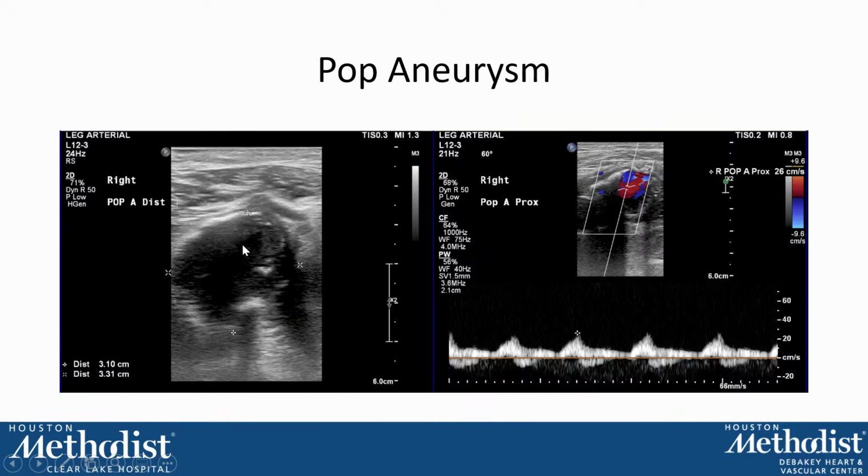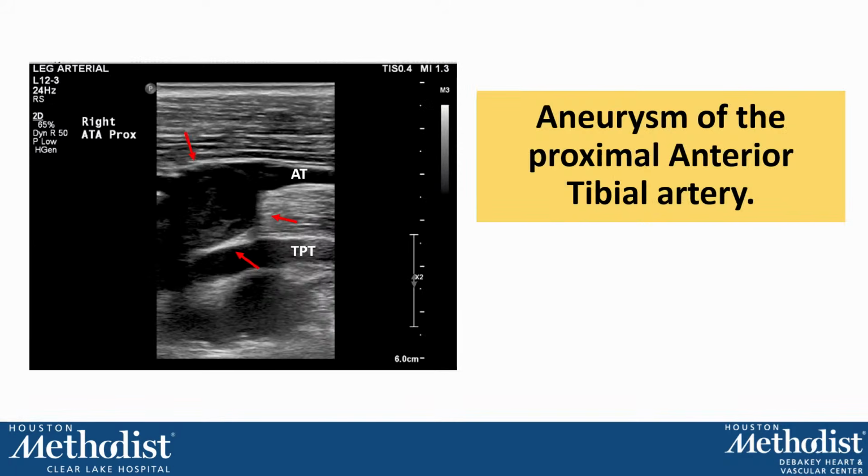And when you start seeing an aneurysm that's not completely thrombosed, you see sort of these more prominent reverse diastolic flow, almost like you're looking at a pseudoaneurysm. It's just that in the aneurysm, you start getting some recirculation. And we're going to get to that.